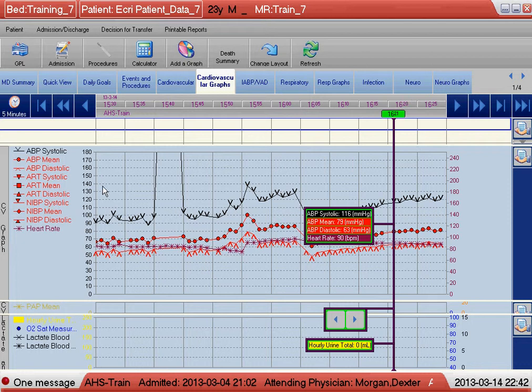And the color red kind of blends in with all the other colors, so I'm going to choose another color for that one, and just, let's say, black, because then that'll definitely stand out. Click that, and then click OK, and let it close, and you can see now that the systolic blood pressure graph is from 0 to 180, and the line color is now changed to black.